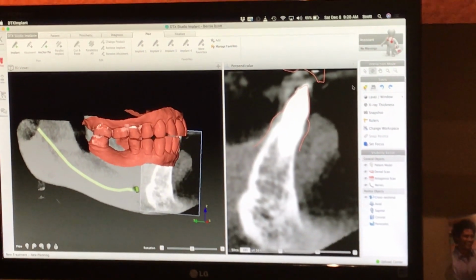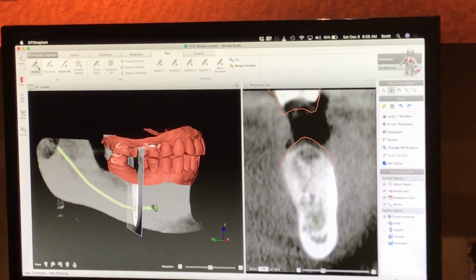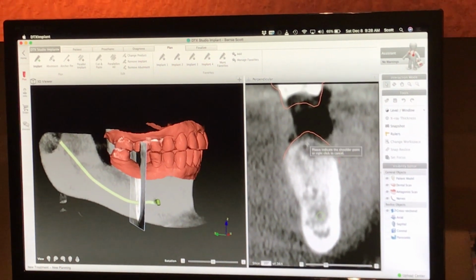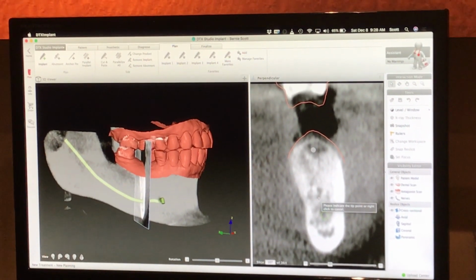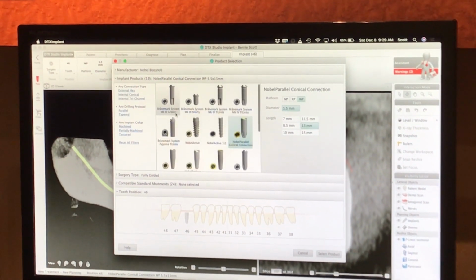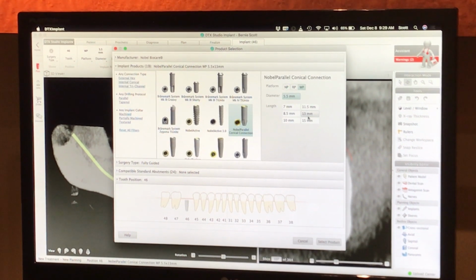So I'm going to do it again. I'm going to reverse this, and I'm going to come in, set the focus where I want to place the implant. Then I'm going to take the implant plus button up in the corner, and come over top of the ridge, and you see my little crosshair? I'm going to put that where I want the drill to go in, and then move down, and so maybe I'm over the nerve about here, and then a window is going to pop up. So I'm clicking, a window pops up, and on this window is a selection of implants. I could put in any different one from Nobel, or you can even choose different companies and plan your implants. But this is saying where I clicked was about 13 millimeters long.